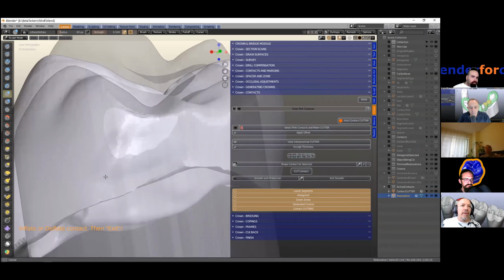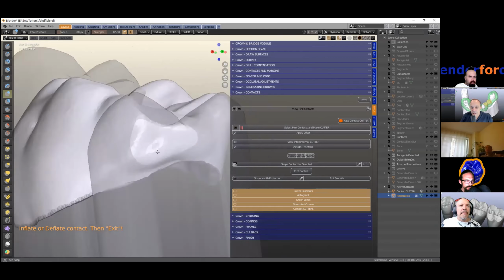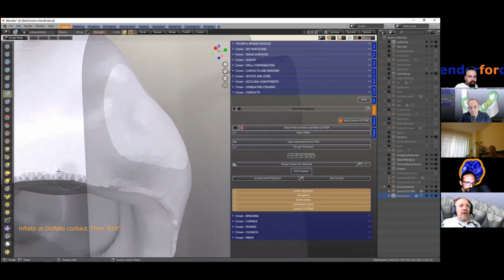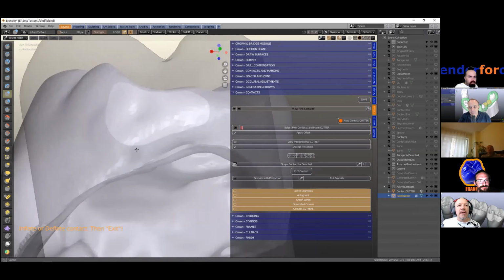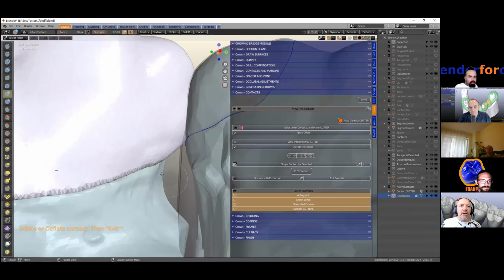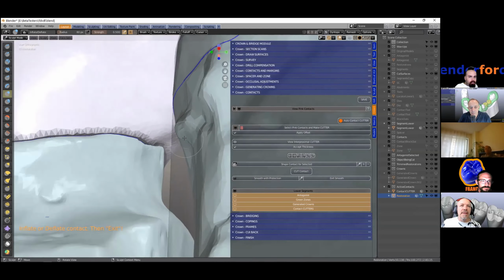Okay, so we're going to go through this. And this is a bit like a glass plane, so we can actually see what we're doing. Protection is still active, Michael. The protection is active here. And notice that this inflate does not harm the margin. Can you see? That's because I've got that special coding in there. So I can actually view this contact and view the lower segment to see how far I want to bulge this contact out.